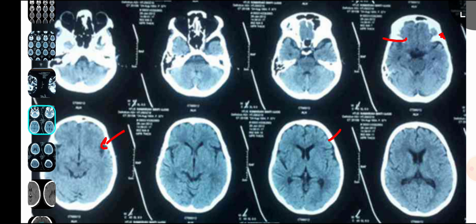So I'm going to give you a trick. That's not a hard and fast rule, but this is how you identify the structures. Where this is not complete, this is no more a parietal. Now it is a temporal lobe. So you have gone a little down there.